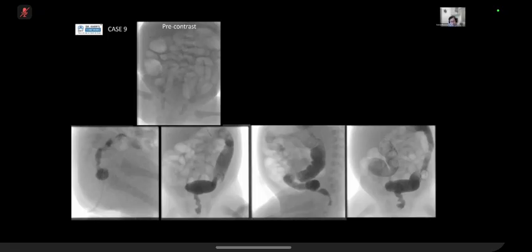Okay, so I think what this image shows is one of the ones that you mentioned earlier, which is Hirschsprung's disease. I thought I would stop and mention the reason why. In Hirschsprung's disease, the main thing you're looking for is your rectosigmoid junction. So how do I tell what's rectum and sigmoid? I often use your sacrum. If you're looking at this, that's probably the area of your sacrum. So that's your rectum, and whatever is anterior to it, or above it, would be your sigmoid colon. So it's important to do this without a balloon.